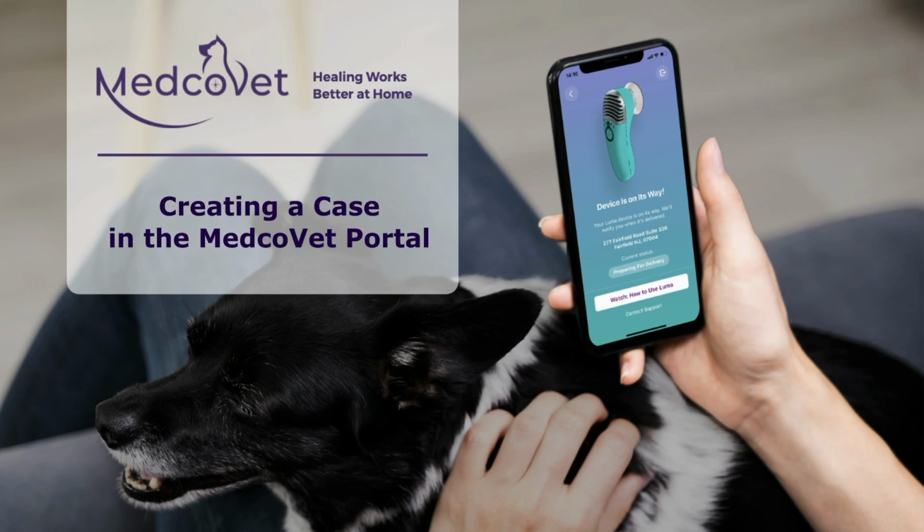Welcome to MedcoVet. This video shows you how to create a case for a pet owner that would benefit from home treatment with the Luma.